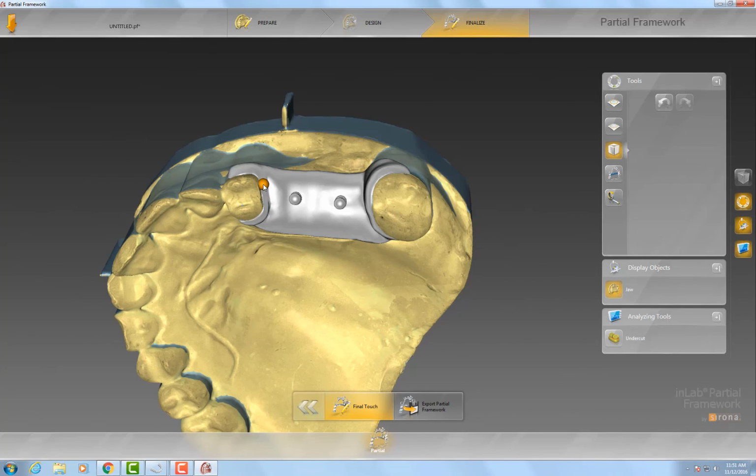So, full circle to what I've been rambling on about in this design: one, you can possibly in the future, is what we're hoping for, print a nylon. Secondary, add your retention here in the software. After you add retention in the software, seat everything if you can, and then import and design your crowns on your actual base plate. Once you do that, you use your MCX5 to mill your crowns.